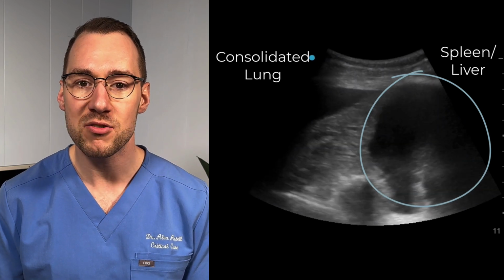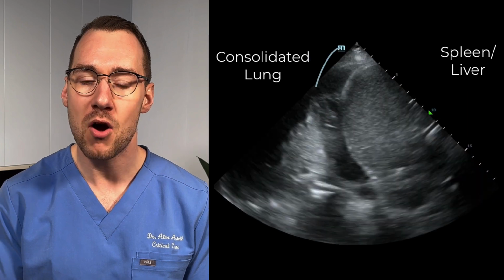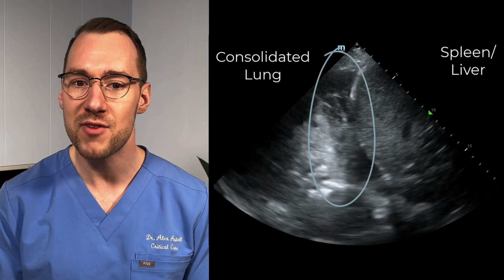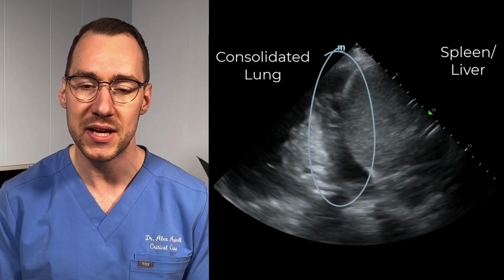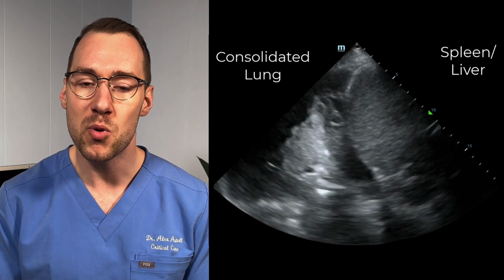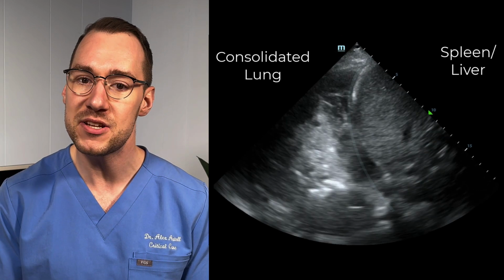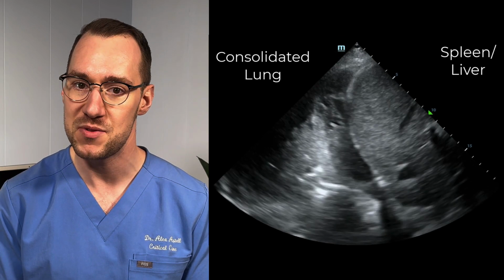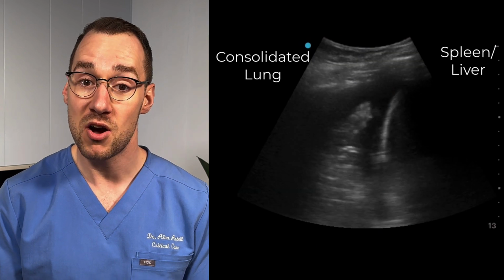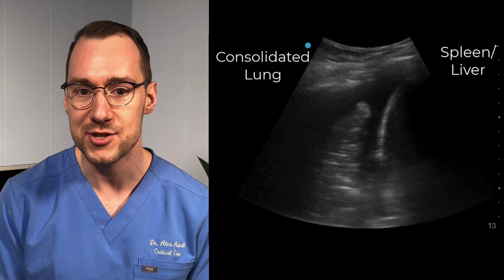It is usually characterized as either a simple, uncomplicated effusion or as a complex effusion where you may see fibrin strands or other material floating in the fluid. As with consolidations, it's really important to find the diaphragm to ensure that the fluid you are seeing is in fact in the chest and not in fact in the abdomen. As to what's causing the effusion, well, that's very much up to what else is going on with the patient.